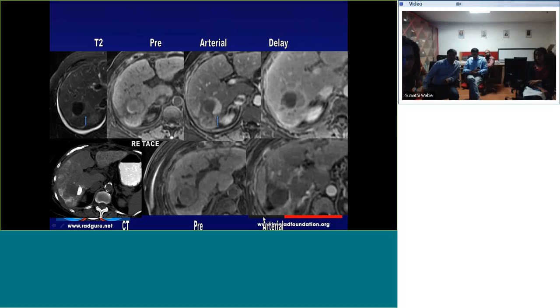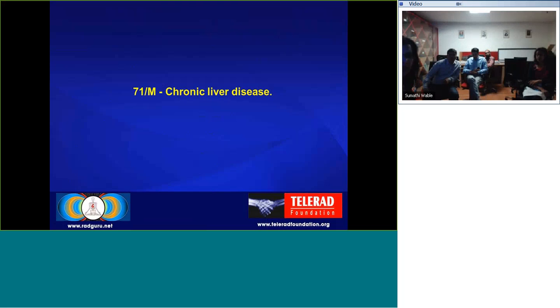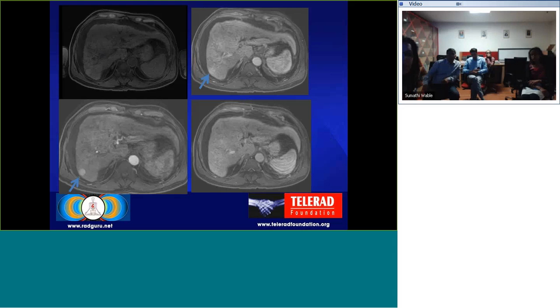And that's what you want to see. And you just have to rigorously apply the same criteria, use everything you got, basically. So this was a case that I saw here. And like I said, use everything you got. Like you did not have the T2, you can ask for T2, I guess. I don't know if it will get you anywhere.